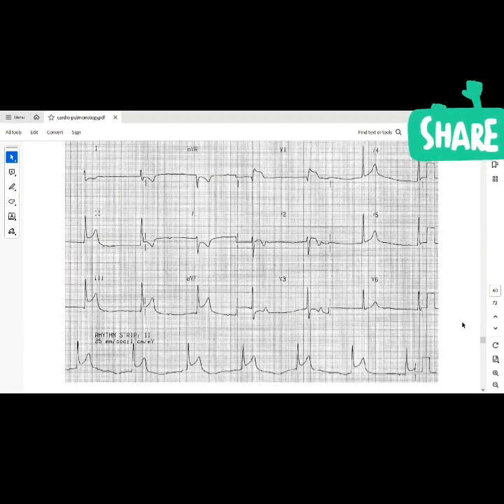So for like the AVF, okay, what is on the AVF? The J point is higher than baseline. So what do you call that? That's called ST elevation. So AVF has that elevation. You're right. So the J point here is starting at a higher level. Okay, go ahead. What else?